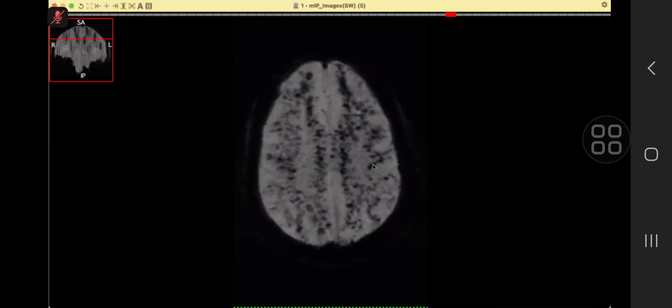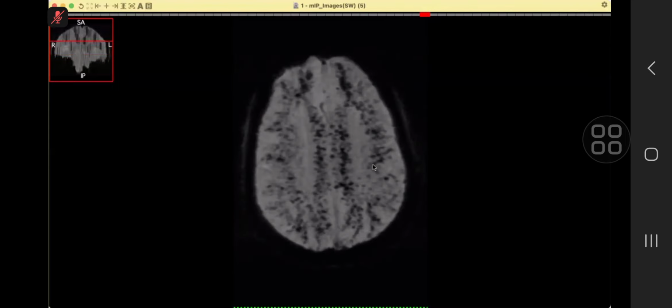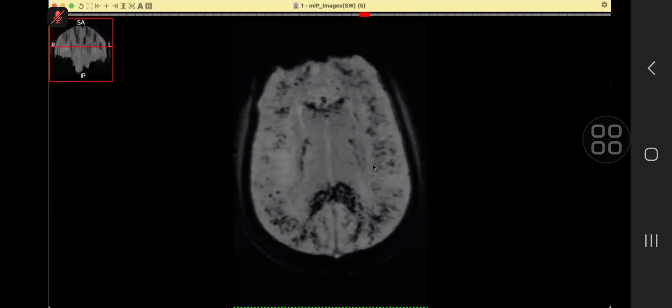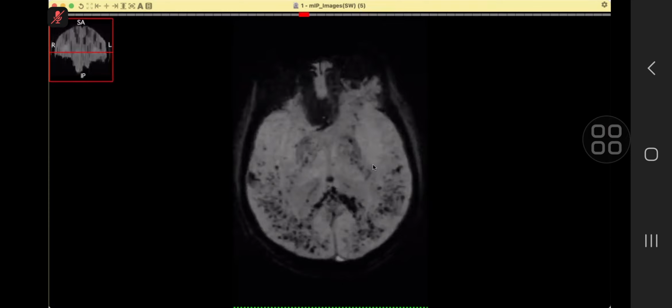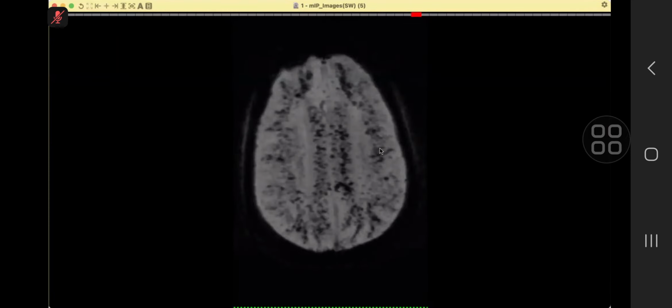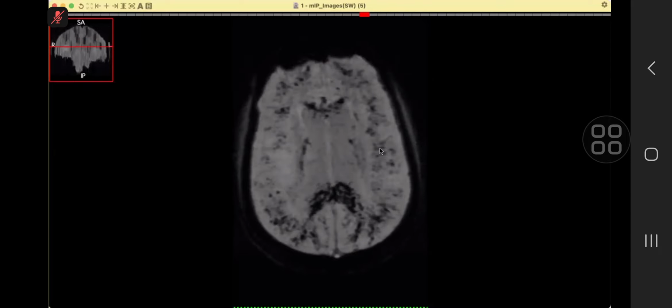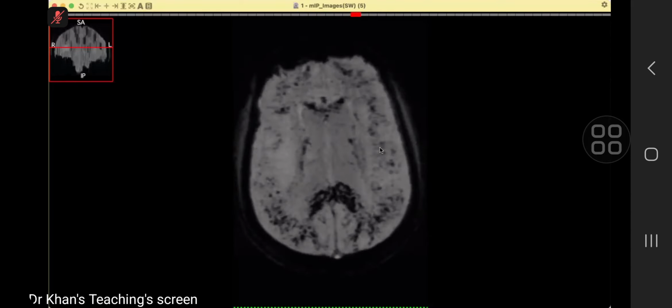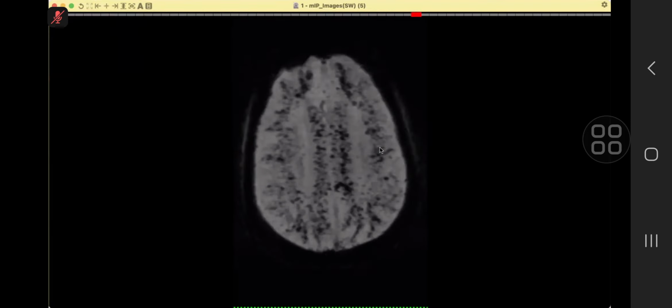Thank you. So angiopathy, you mean to say cerebral amyloid angiopathy? Yes, sir. Either these are cerebral microhemorrhages or cerebral amyloid angiopathy, sir. But in a 23-year-old, most probably it could represent microhemorrhages.